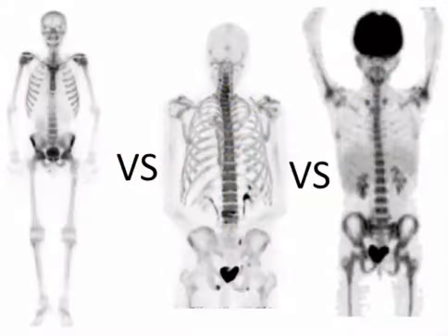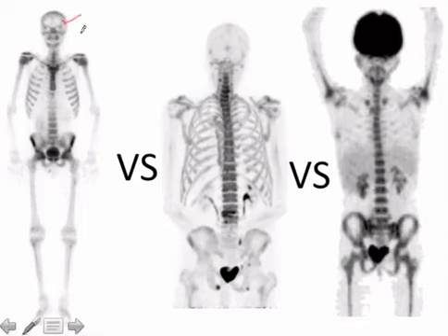All right, next situation. Got 3 different bone scans. Look similar, but they're not. Let's sort of point out the differences. So this looks like a regular bone scan, right? This is the one that we're used to seeing. There's no brain uptake, and it's relatively low count compared to this.